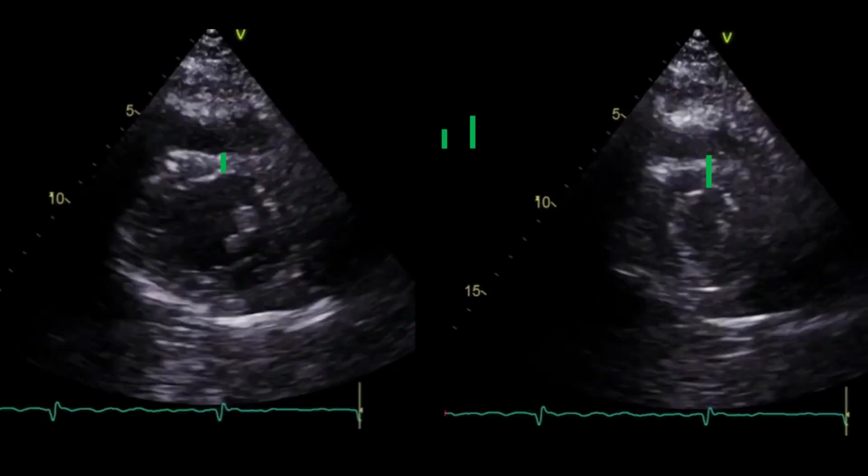Thickening of the walls is similar to having a biceps extended versus flexed. The number of fibers are the same, but they are now packed together and shorter. We expect somewhere along the 40 to 50% wall thickening to be considered normal. You can see here the obvious difference in size of the segments between diastole and systole.